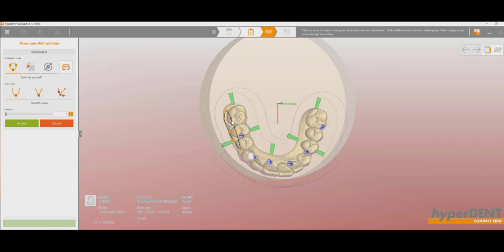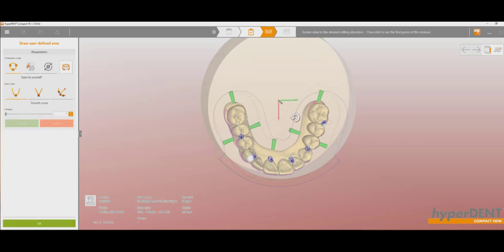I used to have a lot more trouble with failures with calculations. I'm going to select Accept. It takes a few seconds for this to process. I was using the 30 millimeter discs, 98 by 30 millimeter discs, and since I've gone to these 25 millimeter discs, I really haven't had as much trouble. And with all my little issues along the way in learning this, Zubler USA has been really great. I usually work with Ryan McKetron.